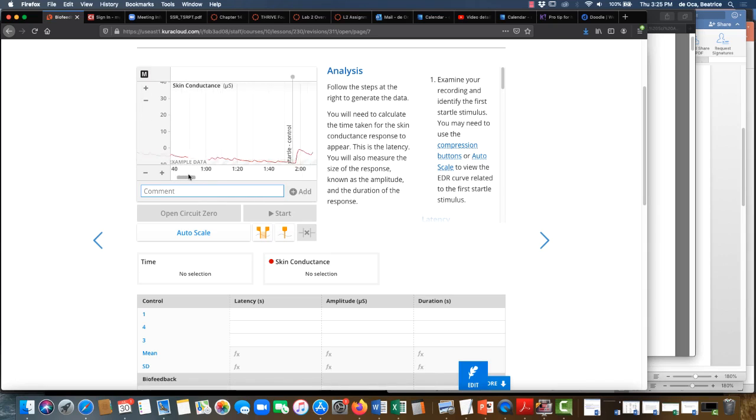So I have a baseline control and then a number of startles that occurred during the control period when the person was just sitting. And then you can see now the conditions changed, and now we have biofeedback, we baseline biofeedback, and then startles that are occurring while the person is viewing their output on the screen, so using biofeedback.